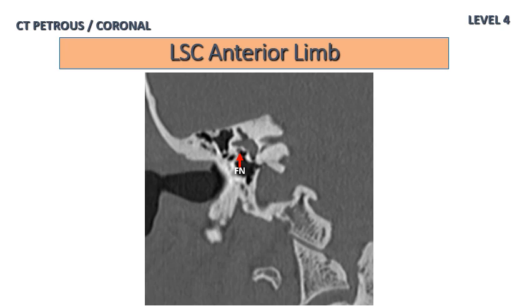It's very important to focus on whether there is a bone covering this facial nerve or not, and whether it is in the normal position or a little bit superior or a little bit inferior at the level of the oval window, or even more inferior to the oval window.